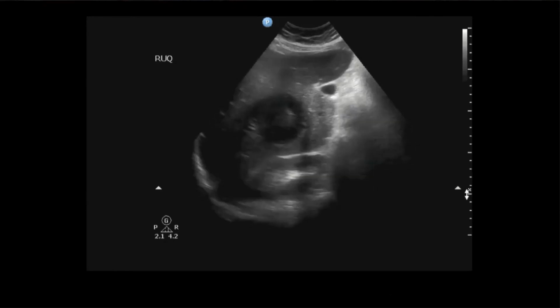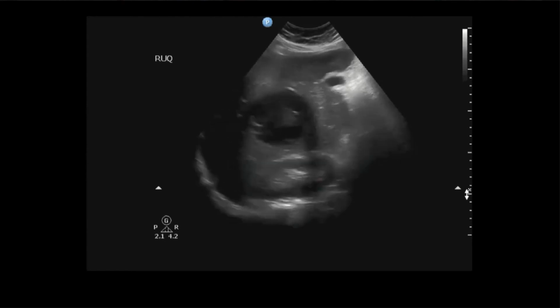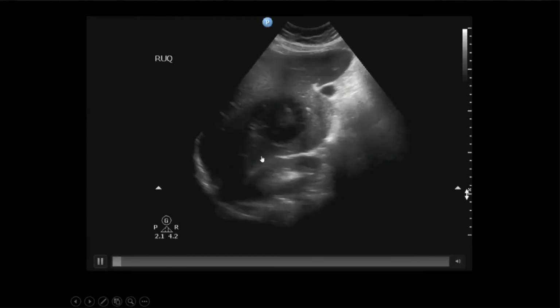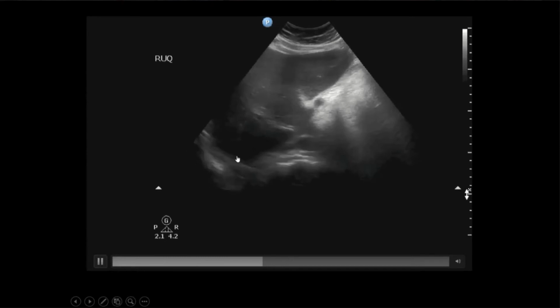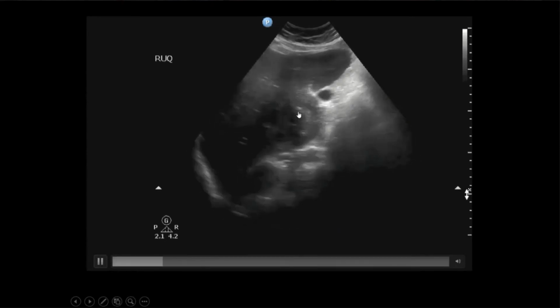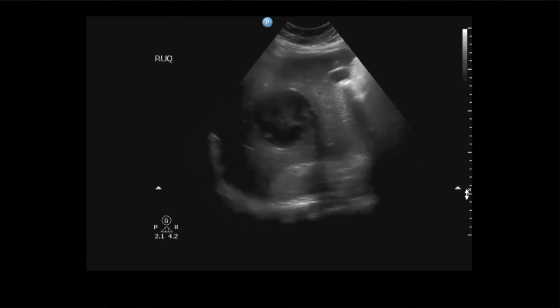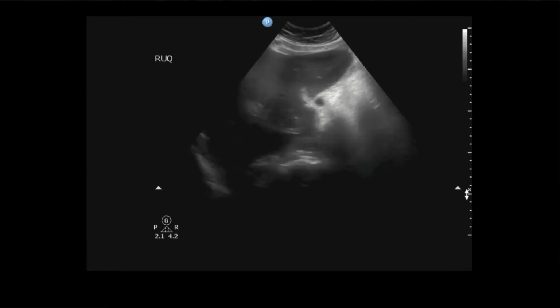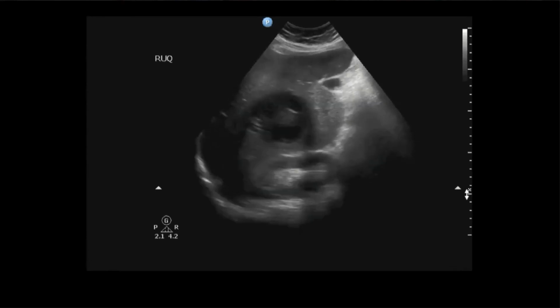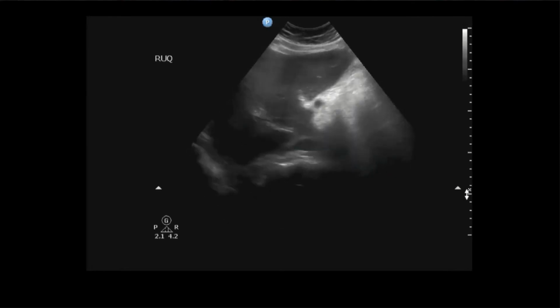That was thought of, but they weren't. We thought it was an echinococcal one, but it wasn't. It was just a regular abscess. And I think it's just the boundary of it that you're seeing. It's like the edge of the cyst. But you can see these echinococcal cysts, and they actually get these daughter cysts, and they have that swirling pattern in the middle, and then they'll have these baby daughter cysts with swirls right next to them as well.